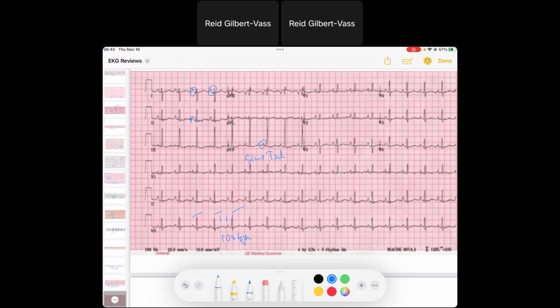If you look, that P wave is kind of high in lead 2, and it's up in V1, maybe more than normal. So this looks like we've got some right atrial enlargement. And that's very, very positive spiky P wave in lead 2, which is what's showing that in this upward portion of the P wave in V1 to the right atrial portion. So right atrium is enlarged.